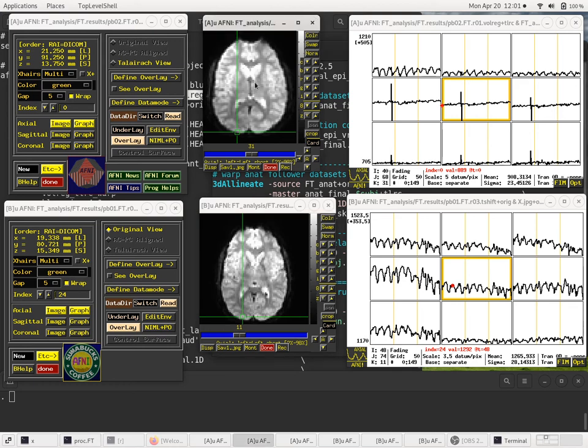One, the volume on top, if you can see it well, is blurrier than the volume on bottom, and of course it is. That's one of the penalties for applying any transformation to the data. Now that means you have to resample it. The voxel grid down here on the bottom was 2.75 millimeters in plane by 3 across planes.